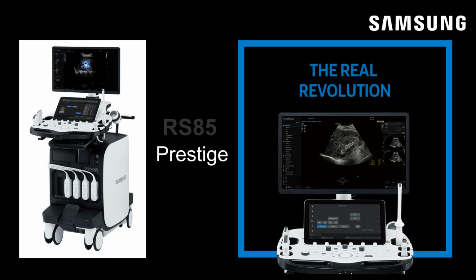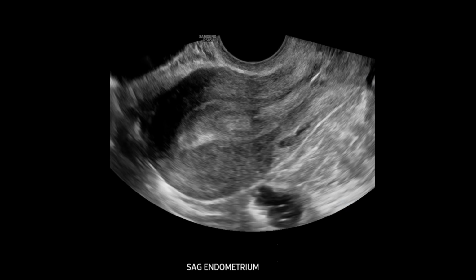I'm going to show you a few examples of endometrial polyps, highlighting key teaching points throughout. Let's start with this case. This is a female patient in her mid-30s presenting with a history of abnormal uterine bleeding. We're looking at an endovaginal ultrasound of the uterus in sagittal dimension. And you can see that the endometrial stripe is somewhat thickened. There's an ovoid echogenic focus in the mid-endometrial body.